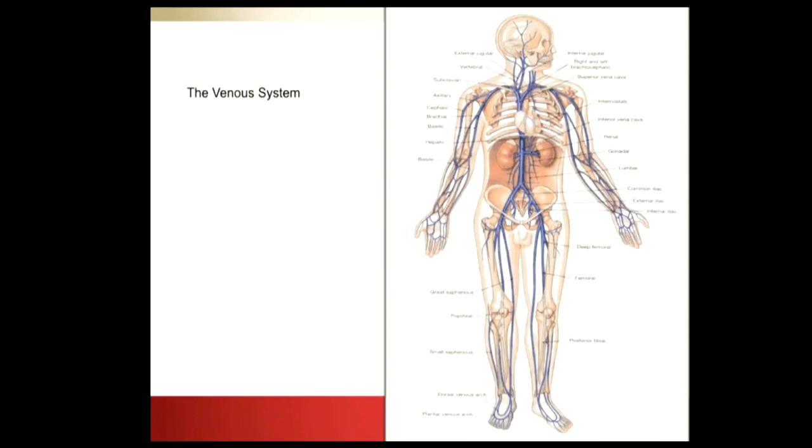But it was an interesting picture actually, because the clot goes above the renal veins, but the renal veins are spared. And why is that? No, there are no collaterals. I mean, just the renal veins. The renal veins are actually open, but it's an interesting picture. So clot, and kind of open, and clot again above and below.